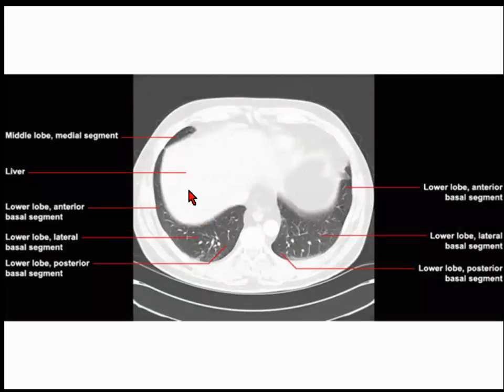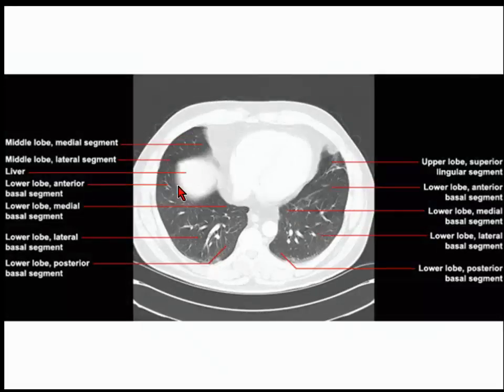So you've got the dome of the diaphragm. That's the area where you get artifacts. The CT acquires very quickly, while the FDG acquisition takes about 2 to 5 minutes and the patient is free breathing, so you can have an artifact commonly known as banana artifact. It's sometimes difficult to differentiate whether this is a liver lesion or a lung lesion. So it would be prudent to look into the coronal sections of the chest, and sometimes you might be able to differentiate one from the other.